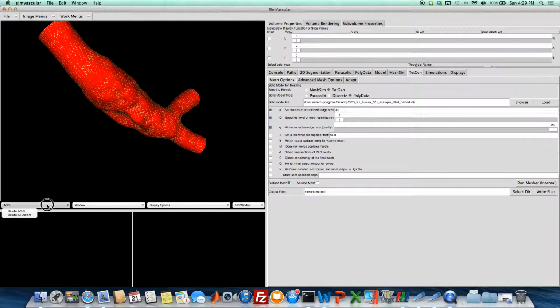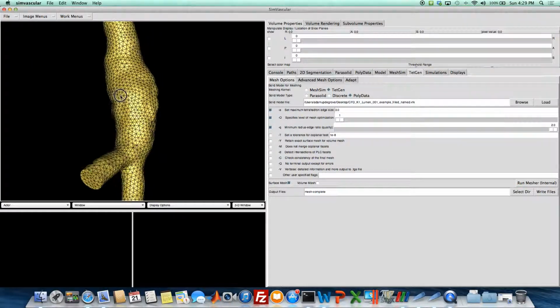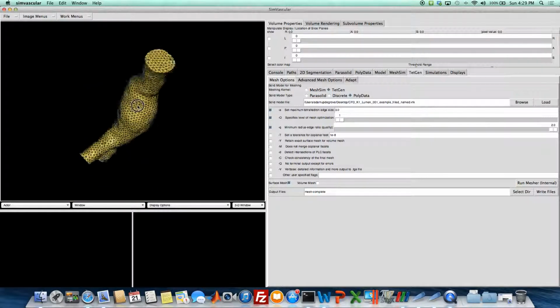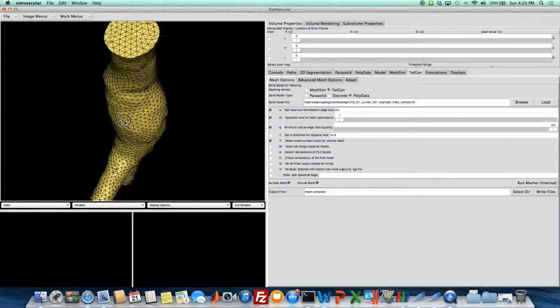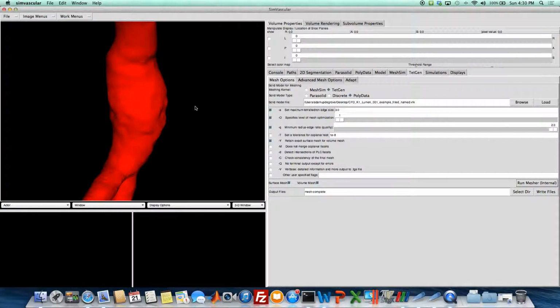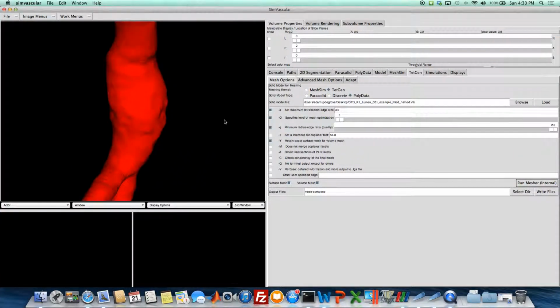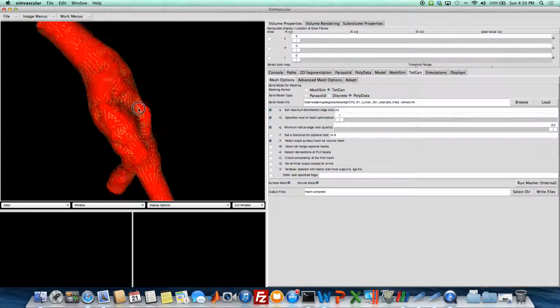But as you can see, we did remesh the surface. And looks pretty nice. So we can run a volume mesh on that if we want. Sure, let's do it. Okay, and I usually like to retain my exact surface mesh. I think this looks pretty good. So we'll run our mesh. And once again, this shouldn't take too long. We're just doing what we did before, just adding the generation of a volume after we have our surface. And we're done. Let's see, 40,000 elements.